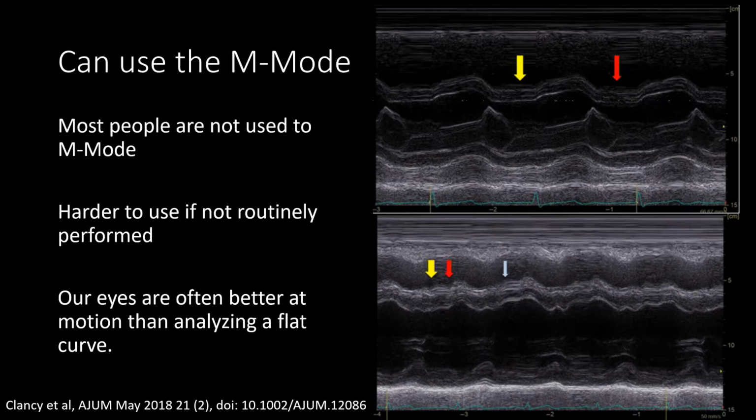We are also in general just better at recognizing movement patterns than we are at fixed images. In summary, M mode is not essential for most basic gross applications, but it is quite useful and essential for things such as constriction and restriction, which is the lower image on this slide. I suggest using it for timing in some of the more obvious applications to confirm your findings.